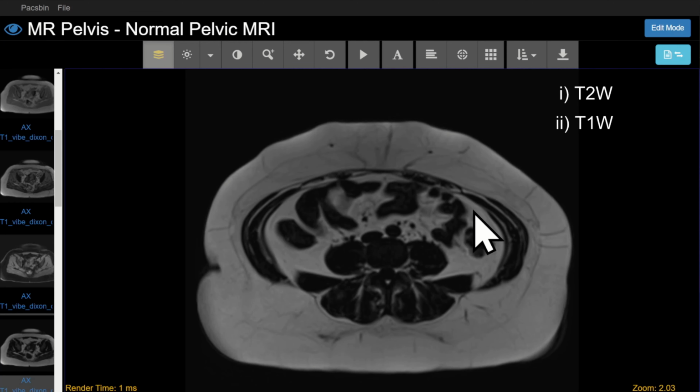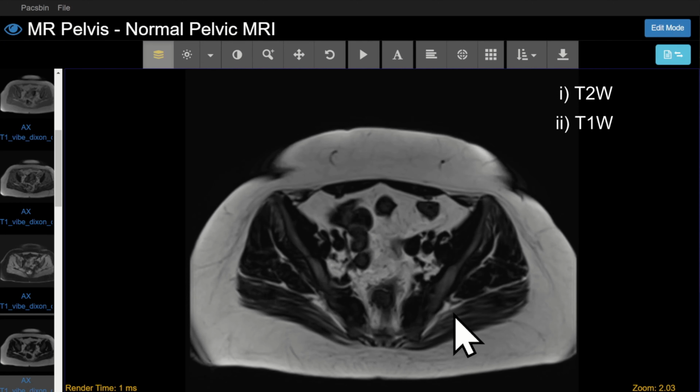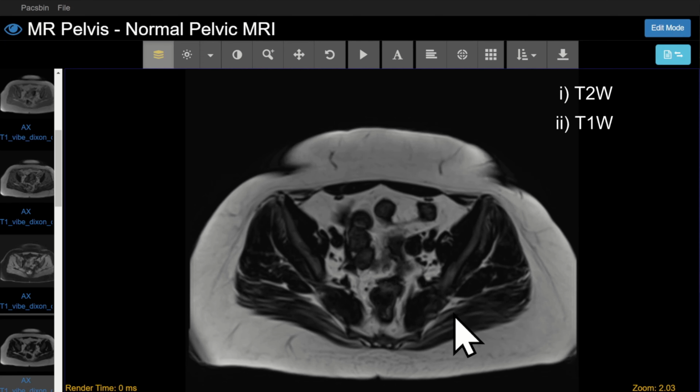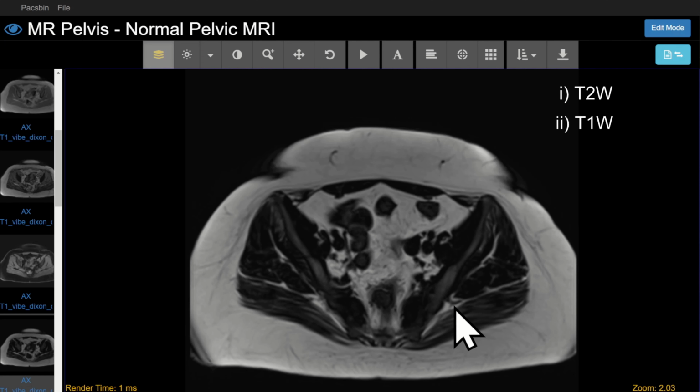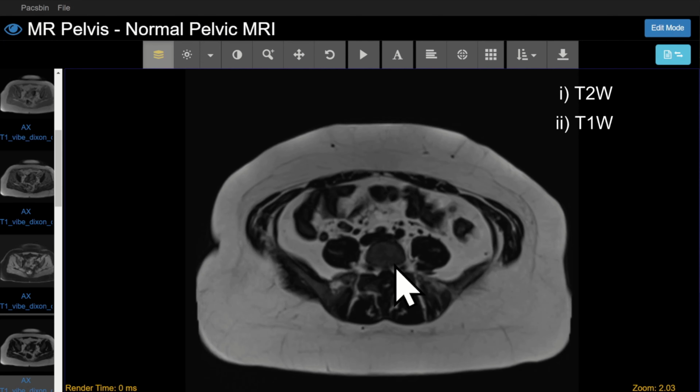The fat only image here will show both bulk and intravoxel fat. This sequence is also very helpful to quickly identify any fat in tumors and to look at the bones. So notice that there is normally fatty marrow in the bones here, and so any marrow replacing lesion is going to show up as dark on that bright background.